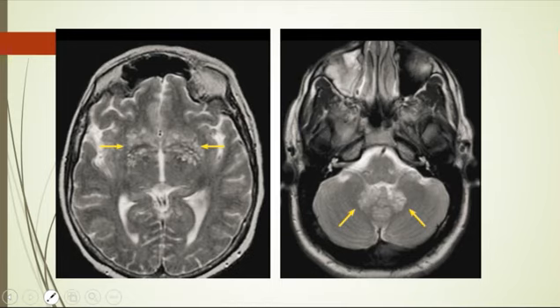Anybody? Diagnosis or differential? Cryptococcosis, exactly. Cryptococcosis commonly presents with this gelatinous pseudocyst or soap bubble appearance.